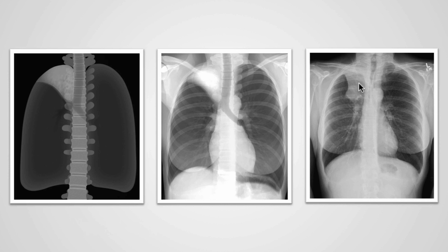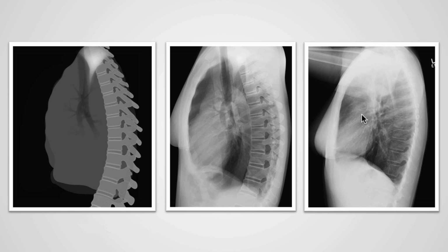In these more advanced cases, we would expect that the hilum would be elevated and that there would be compensatory hyperinflation of the remaining non-collapsed lung. On lateral film, the collapse may be very difficult to identify as the collapsed right upper lobe continues to lose air and becomes hidden within the soft tissues within the superior aspect of the hemithorax.